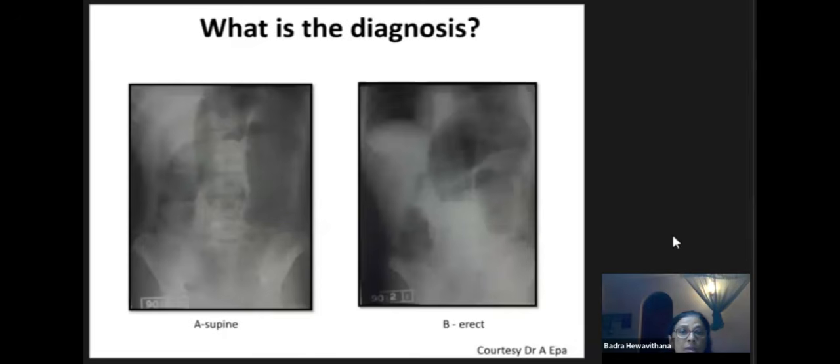So this patient, this is absolute constipation. What is your diagnosis? I think you all should know these things. Most of these things I have shown in undergraduate lectures. How many of you are there? 75 are there. I'm sure you all know the diagnosis.